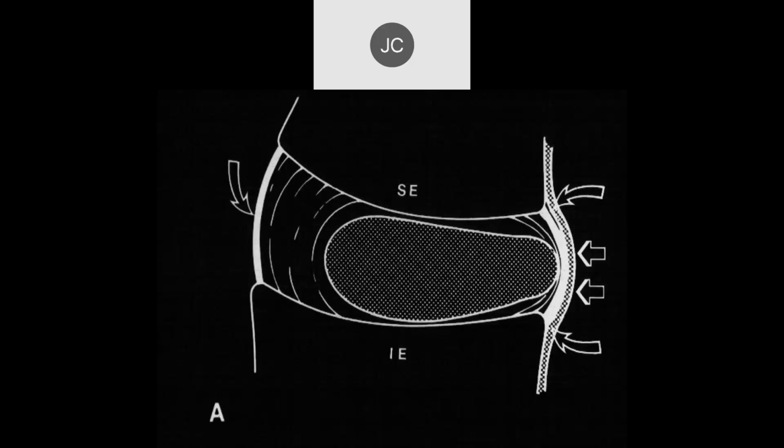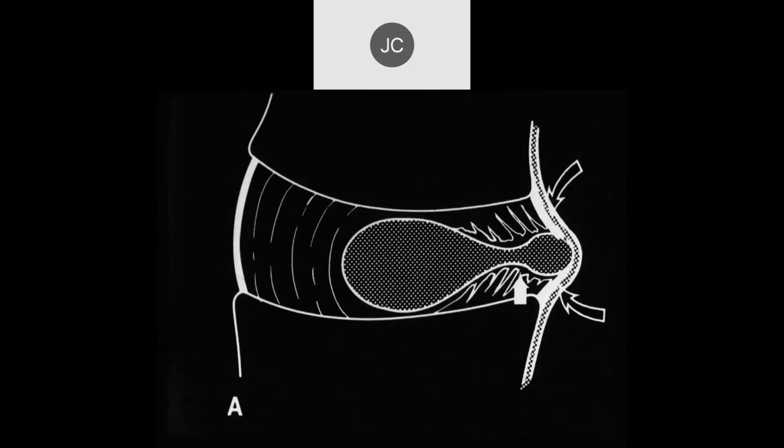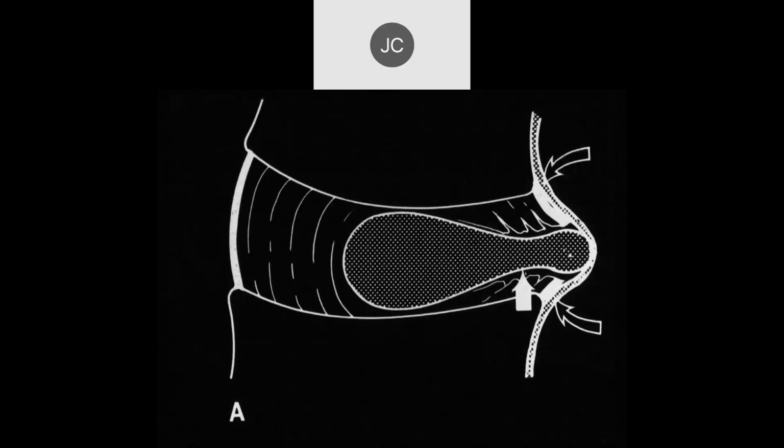Yeah, I agree. And so here you can see this cuts through Sharpey's fibers, but doesn't really go through the periphery of the annulus. A little bit more, you can have a partial tear of the peripheral annular fibers, and then you can have a complete tear of the annular fibers where the disc, the nucleus pulposus, is right up against the posterior longitudinal ligament, and therefore this has a direct connection now to the soft tissues. The epidural space would be out here.